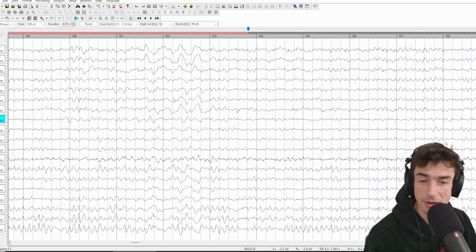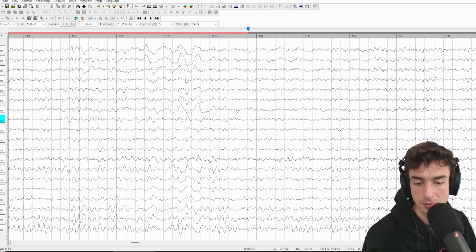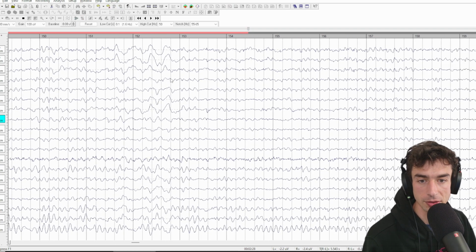Is it eyelid flutter? Is it frontal theta? Just like in the eyes open, we're not totally sure. I'm inclined to think it's frontal theta.